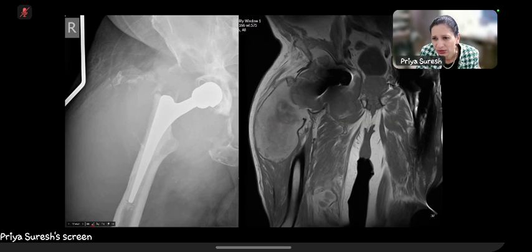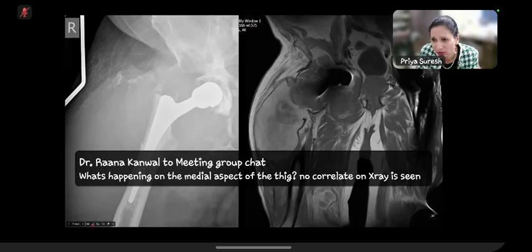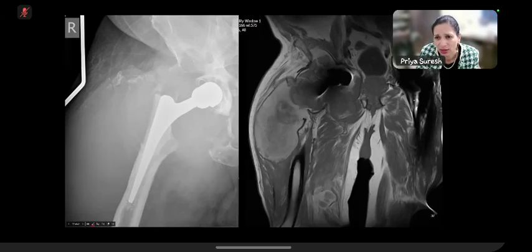Remember, he started with that on the other side, but it was operated, and therefore it was not so catastrophic. We didn't see so many changes, so much osteolysis. Whereas this one, he left from 2012 to 2021, nearly 10 years, 8 or 9 years. So it has had enough time to grow and then slowly eat the bones.